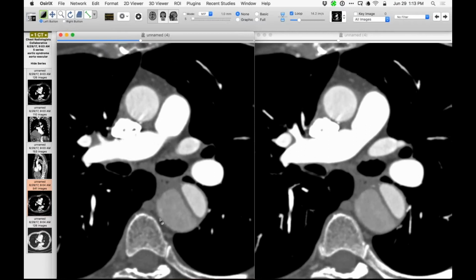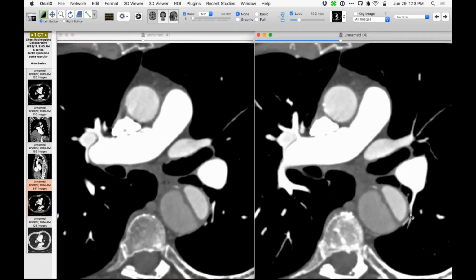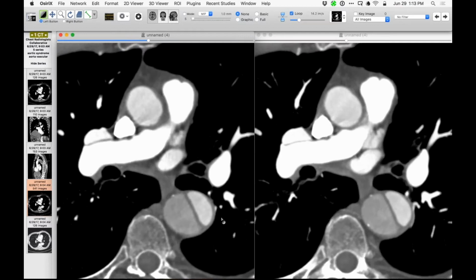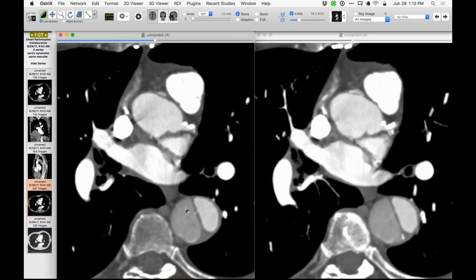They're small, so just bear with me. Okay, the first one I thought I saw was right here. And you can see it right there. So let me just scroll back and forth through there. Sometimes you can see that a little bit better when you're actually scrolling. So that's one location right there. And then as I went down, I thought I saw another one here.